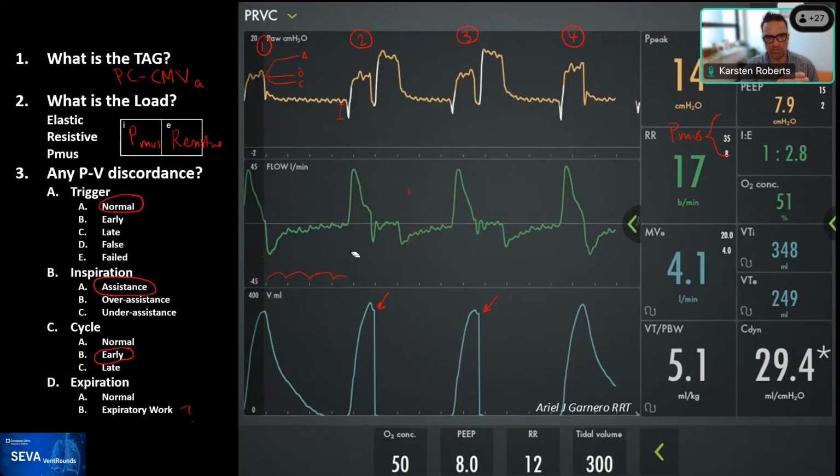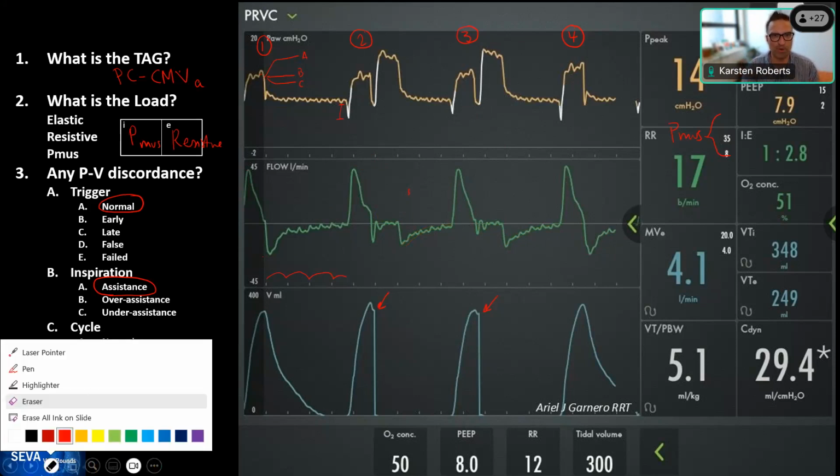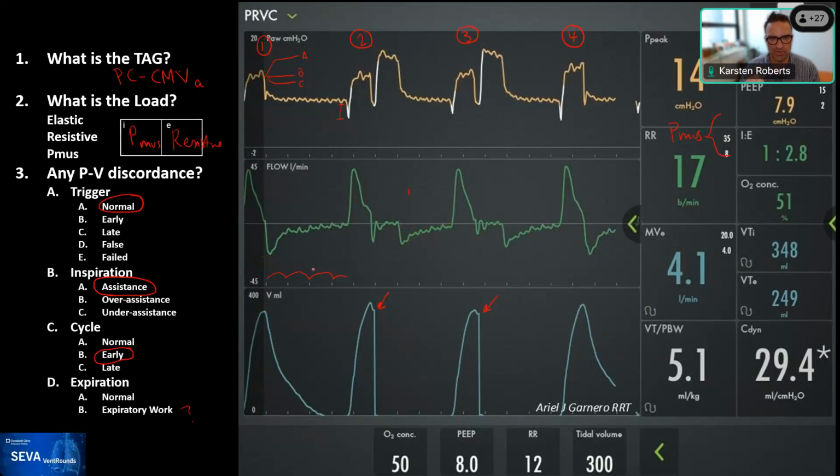It's more so than the previous breaths, and we actually don't see that pause. We don't see that second breath. I think that's really interesting that that fourth breath doesn't trigger another breath, or it doesn't stack that breath. Yeah, I agree with that.